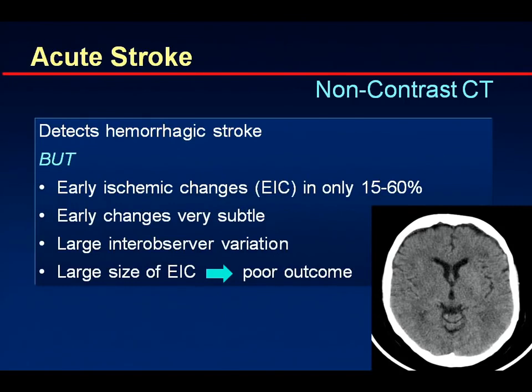These changes can be very subtle. You've seen some subtle changes, but this one also has a stroke, and you do see some early changes on it. So you can have a quick look and decide where are the signs of stroke on these non-contrast images.